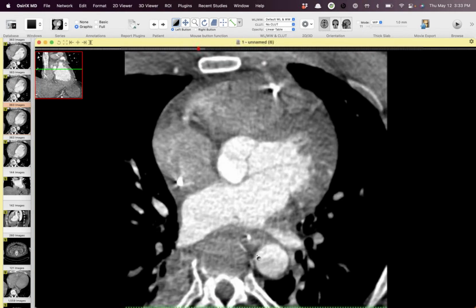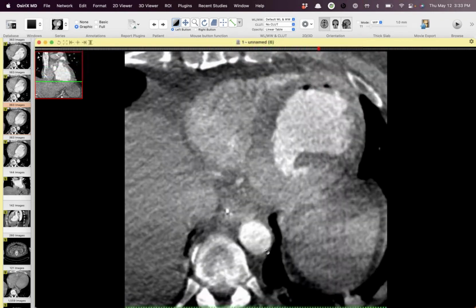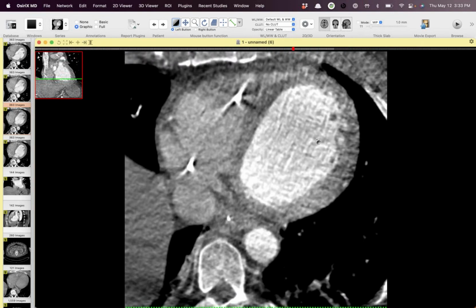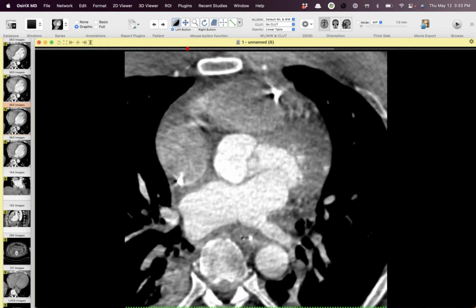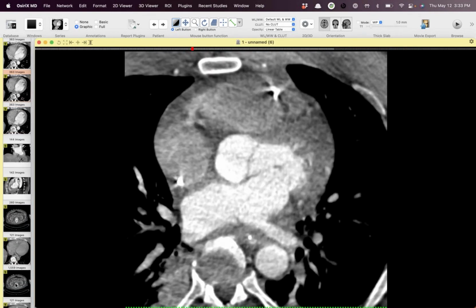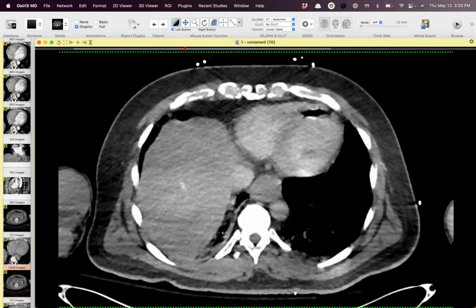So it's hard to see the actual tract. You shouldn't, because it's an intermittent fistula. Otherwise, they just get such a high volume of air that they don't survive. And at this time, there's still a little bit of air left in the left ventricle, but not as much left. So this patient did go to surgery. They found about a 2 centimeter hole in his esophagus, 1 centimeter in the atrium, and were able to patch it up. Now, by report, he also had air emboli in the brain, but has survived, which puts him in the minority of patients and hopefully will recover. But this is another atrioesophageal fistula. And so, with improved techniques, these are supposedly decreasing in incidence, but they're still important.